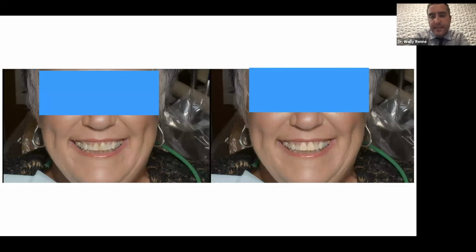And the first stage that you really utilize the software in is patient communication. So in this instance, this lady presented to me in my practice, and she said, I want 2 veneers on my 2 front teeth because I hate my front teeth. And I immediately look at her smile and know that 2 veneers is not going to help her smile. But how do you present that to a patient without either trying to sound like you're trying to sell them a lot of veneers, or sounding mean, like, hey, 2 veneers is not going to help you, you need tons of work? That's really mean sounding.